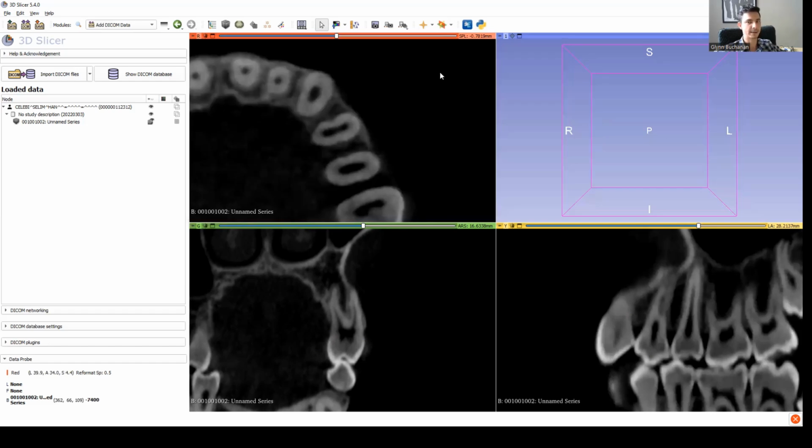It's basically a two-rooted premolar with one buccal root and one lingual root. We call it a lingual root. It is technically a palatal root, but the way that we made the classification on the drop-down menus, it's a lingual root, and just a single root on each side with a single canal. Okay, so very, very simple.